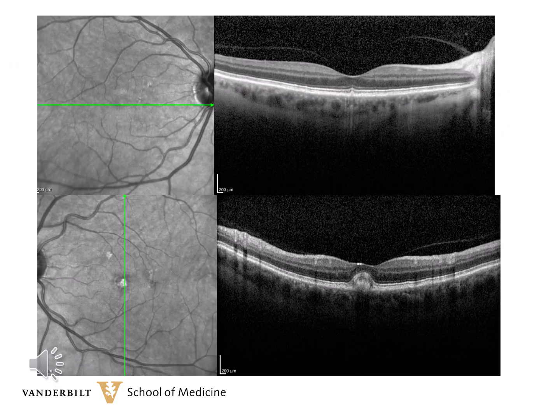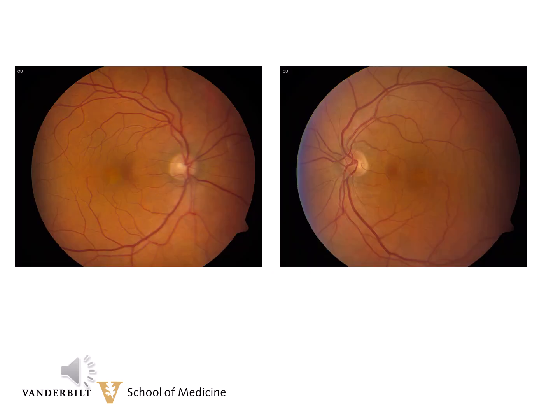And here is her OCT. The right eye, I would have to read as normal. You can see the thickness of the choroid is normal, and there are no other RPE changes that you can see on the right OCT. But the left eye shows the typical findings of pattern dystrophy. Other than the typical hyperreflective spot under the fovea, the OCT can show liquefaction of the vitelliform lesion. This patient shows that finding.